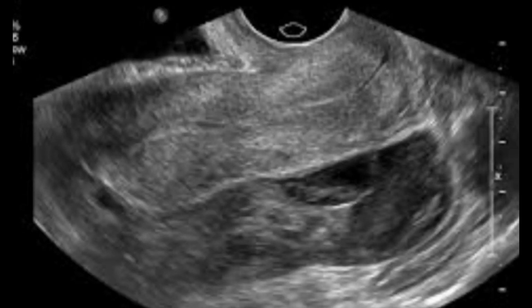So this is for sure pelvic inflammatory disease, because no fluid can be contaminated with infective materials if it is not pathological. So this is actually a pathological process. However, the uterus is clear. Within the uterus, the endometrial cavity is okay.